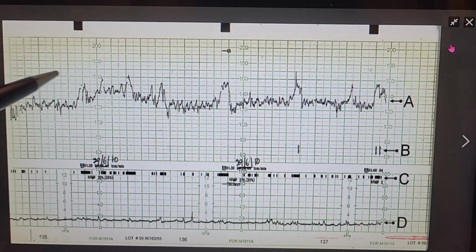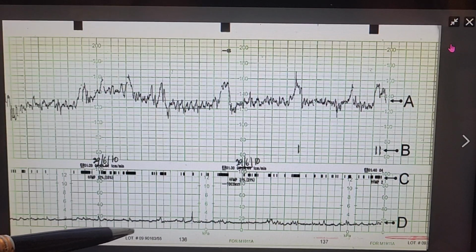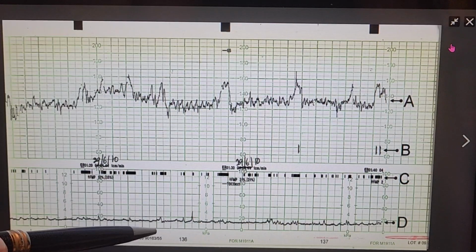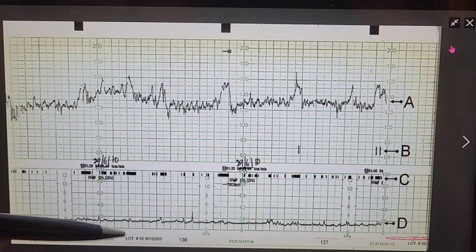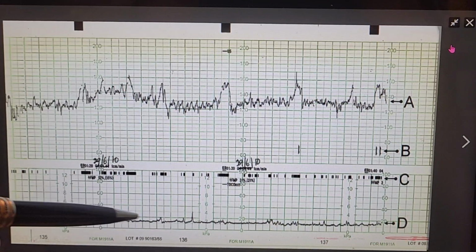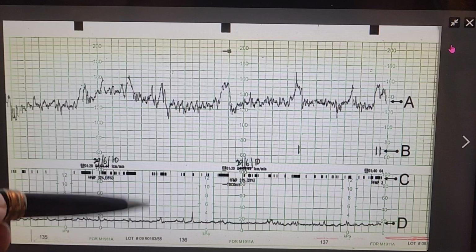First of all, in any CTG there is data information, where you have a sticker stating the patient's name and medical record number. Then we have the lot number, or serial number, and this number never exists twice. Meaning if there is any medico-legal case or investigation, they cannot replace the serial number of a CTG with another from anywhere in the world.